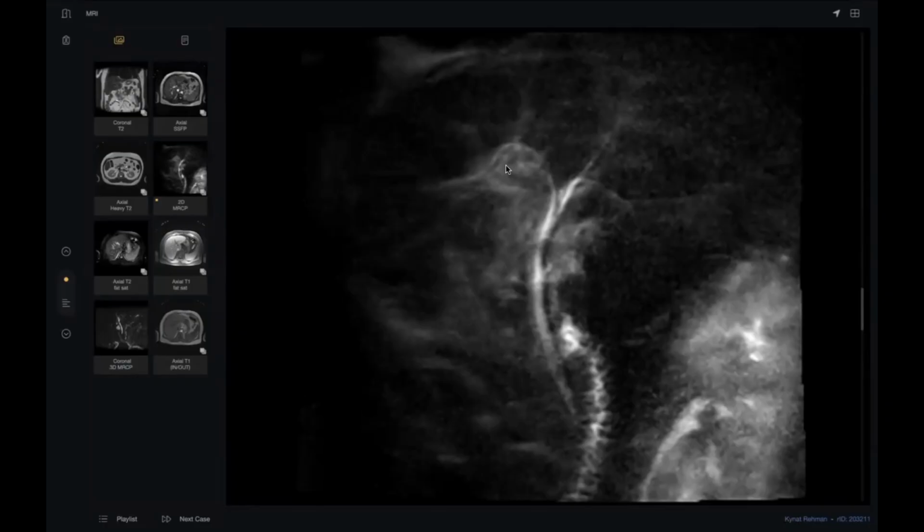Cholangiocarcinoma. If we give contrast, by the way, no contrast images are available in this case, but if we give contrast, could you describe for me what will happen? So it will show the centripetal enhancement, the gradual fill-in, just like a hemangioma. But it's not nodular. No. See, gradual enhancement is more characteristic of hemangioma. Don't say it like this anymore.